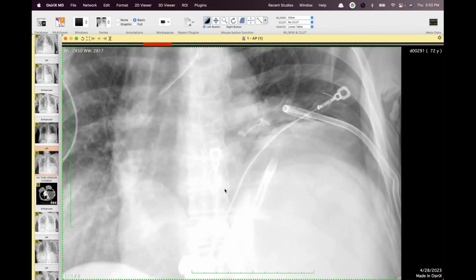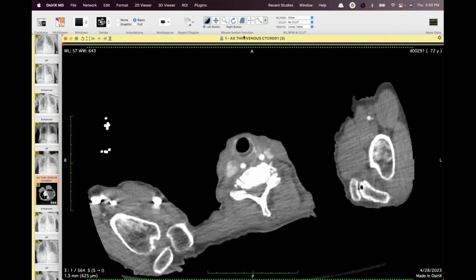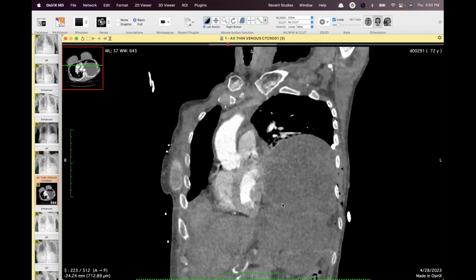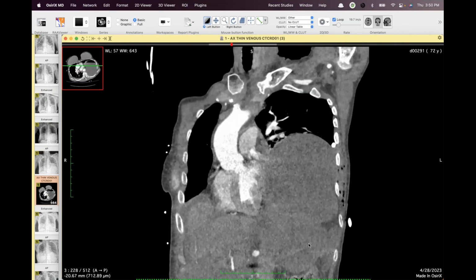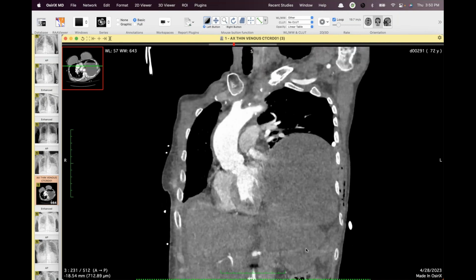Travis, do you have a coronal that shows the defect? Coronal and sagittal. It's hard to find these things. Yeah, I know. I think I got a little bit of a collar sign, especially right in here. No, keep going. Yeah, down there it seems right there. Maybe somewhere there. Let me just do an MPR so you can have a sagittal and a coronal.